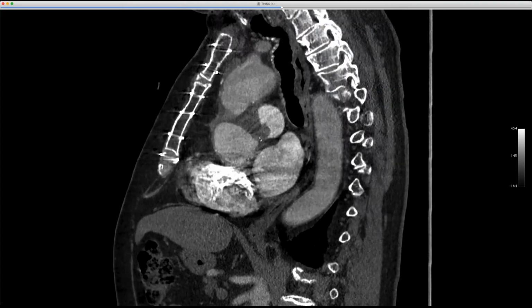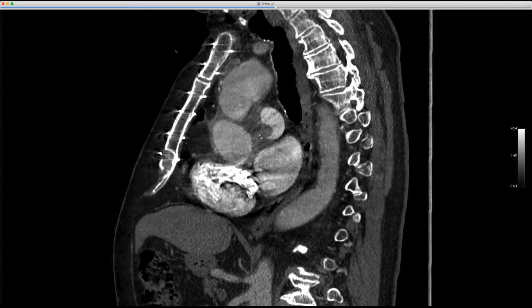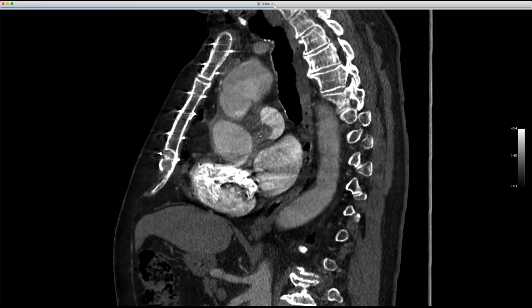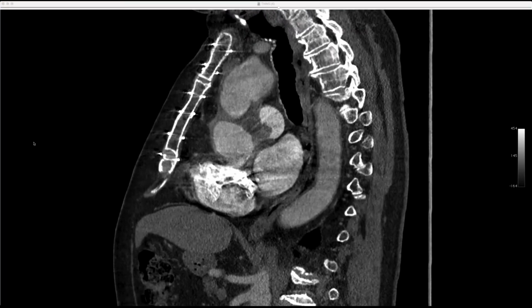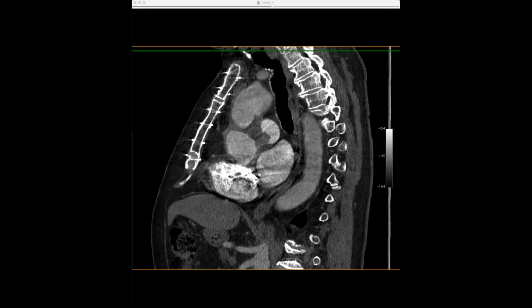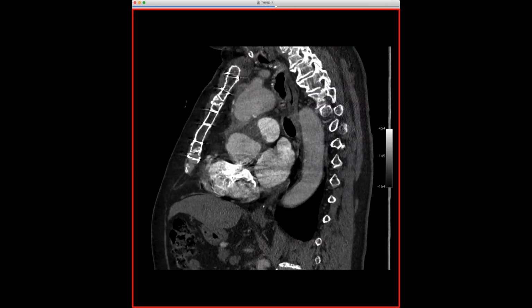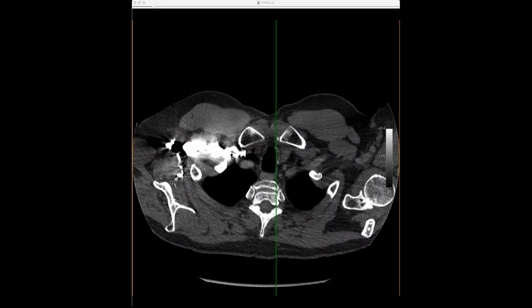It doesn't look like thrombus, and it doesn't look like a tumor. I only have two months' worth of CTs that show no change over that period. But I was just curious, Brent, you're online, if you'd ever seen something like this, or anybody else. So Jeff, is your presumption then that this is part of the pseudoaneurysm that is just mashing into the pulmonary artery?